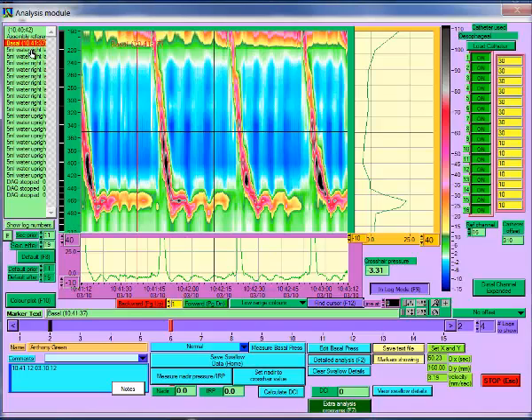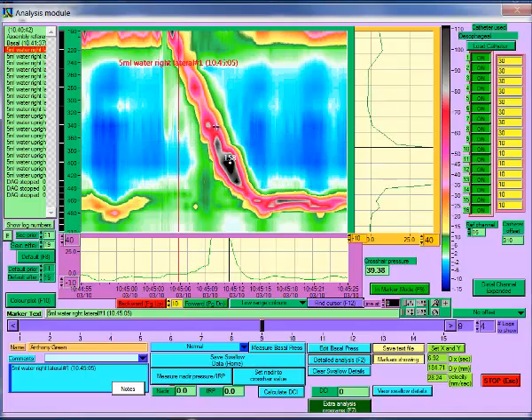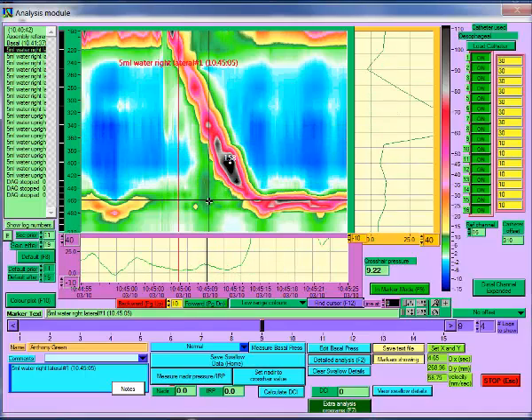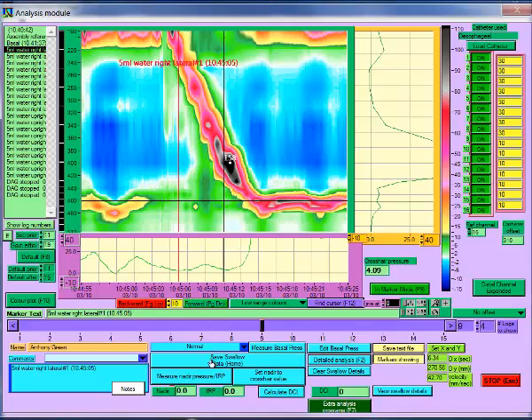Click on the first marker corresponding to a swallow, and that swallow will appear in the colour plot. Move the black crosshair cursor around. The pressure at the intersection of the crosshairs is shown in the crosshair pressure box. If you position this at the nadir pressure and then click on Set Nadir to Crosshair Value, that pressure will be recorded as the nadir for this swallow.